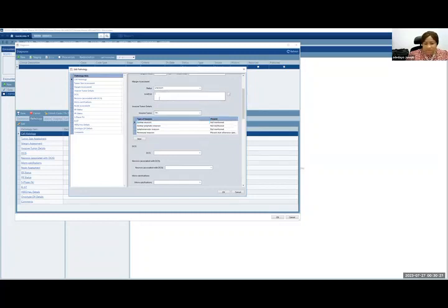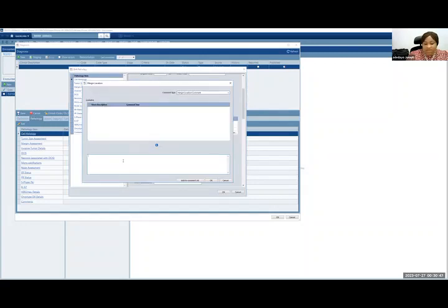In the margin status, I forgot to talk about the location. So we've said margin status is unknown. That's why I didn't put in the location. But let's say I was saying the margin status is positive, not otherwise specified. Now you can select location if you have that information. And what I want to point out up here is that you can create templates. So I can just add some little more detail to say, margin is less than, let's say less than 1 cm from outer margin.